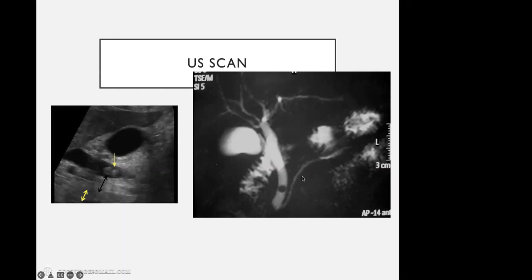You need to see the pancreatic ductal anomaly, the biliary ductal anomaly, and the drainage of the cystic duct. When the patient has cholelithiasis and choledocholithiasis, I need to tell you whether the cystic duct is low lying or its location is normal, and whether there is any accessory right hepatic duct present or not. You may miss it. When you open, you should be very careful when you see and clamp the cystic duct. You should not clamp the accessory right hepatic duct. And is there any pancreatic ductal anomaly present or not? All these things, I think I need one more class down the line to describe.